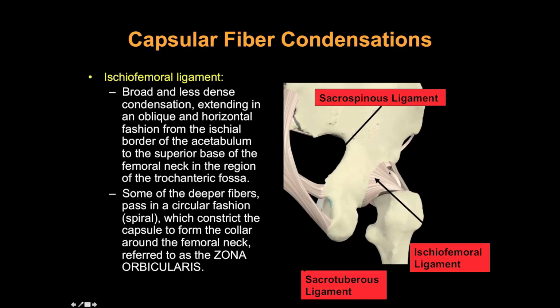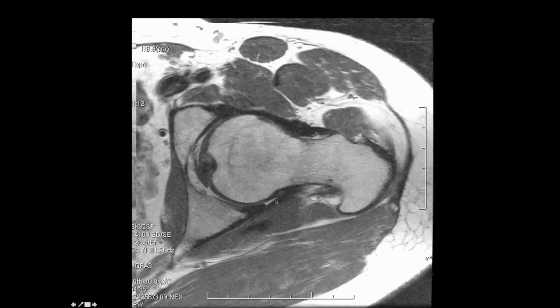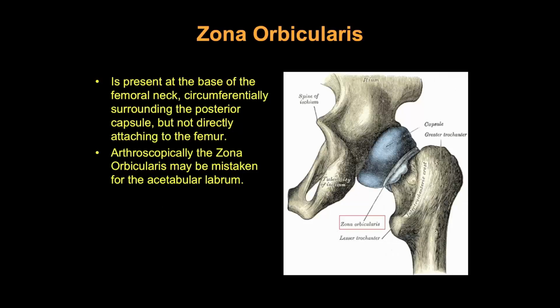And so here is that ischio-femoral ligament. Posteriorly on axial images, we see the ischio-femoral ligament here. See that ischio-femoral ligament posteriorly. On sagittal images, we'll catch the ischio-femoral ligament here, deep to the piriformis, superior and inferior gemella, and obturator internus. So ischio-femoral ligament.